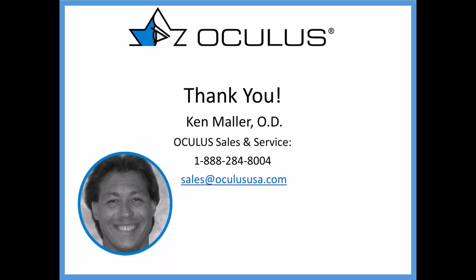Typically I will use the HVID and add 4 to that for my first default lens. So in this case, I think we had a 15.6 millimeter lens. You can be assured I measured the HVID at 11.6, and that's where I got the 15.6 from. So that's a good starting point for me.